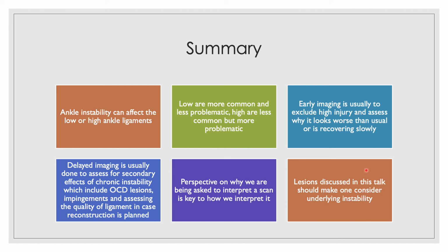So last but not least, I think what happens is we talk about a lot of entities like sinus tarsi, anterior impingement, posterior impingement, OCD lesions, subfibular impingement. We talk about all these lesions in isolation, but remember they're not in isolation. There is an underlying biomechanical process that is going on, which then results in these happening.